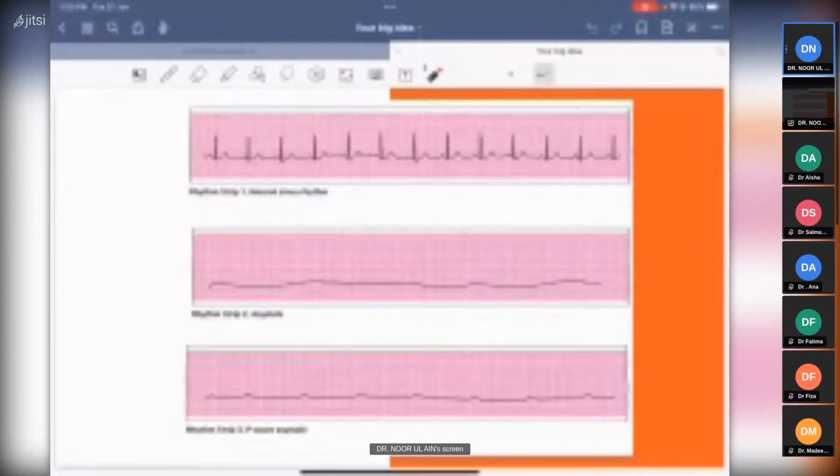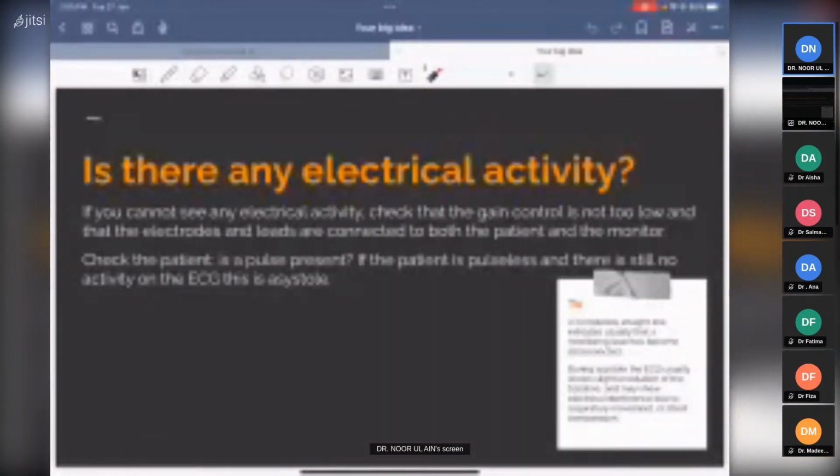This still has a P wave. So once you put up a pacer, you still can get some sort of cardiac output. Okay? But still, this is an asystole. Right? Everything clear so far? Anybody has any doubts, please ask me. Everybody, do you guys have any doubts, any issues, any concerns, or is asystole clear for everyone?